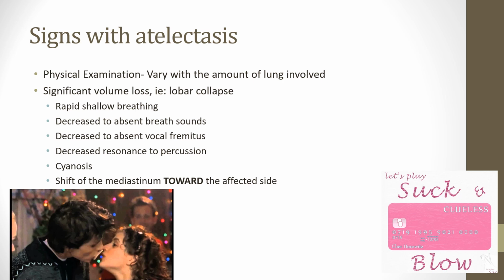And then remember, if it's inside the lung, it goes towards it. It sucks it towards it. If it's away, it pushes it away. It blows. So you're seeing that happen here. If it's atelectasis, the trachea and mediastinum will go towards the affected side.